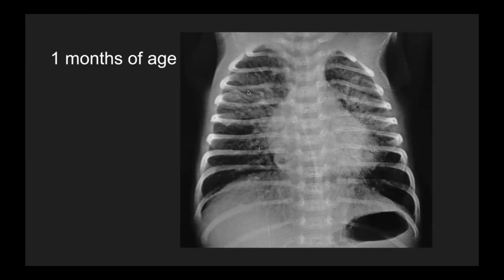And this is the interstitial pattern, the peribronchial thickening, peribronchial areas of consolidation in the left side, also on the right upper and mid zone, and extreme hyperinflation. So this is not a 1 month-old kid's lung. So we have to understand that there is predominant hyperinflation. So we have to keep a viral infection at that time in mind. Now, what may have happened that the child from that viral infection went to this kind of complete opaque hemithorax? Only one answer is that there has been a collapse. Now, what was the cause of the collapse?